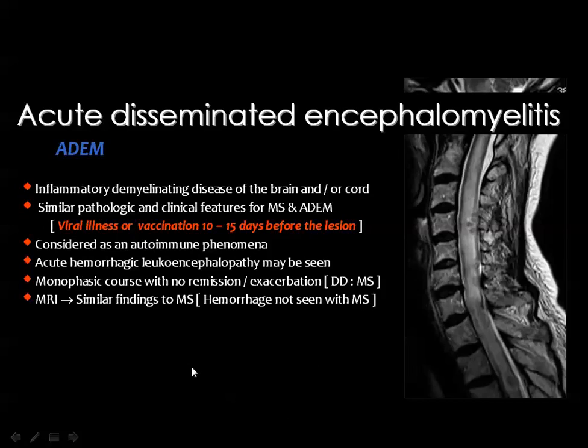The lesions will appear of low signal in the T1, high signal in the T2 and the FLAIR in the brain, and high signal in the T2 weighted images in the spinal cord. And if you inject the contrast media, lesions may show contrast enhancement, but commonly they do not show enhancement.